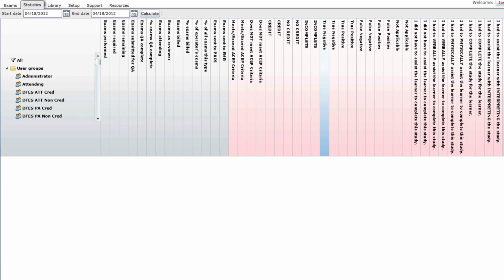If you click on the statistics tab, you can see a report based on ultrasound volume, performance, and credit. You can only see the statistics for yourself. Additional statistics for the group can be run by the core faculty, but in your case, you can only see your own QA sheets and your own statistics to provide privacy. In order to take this data and run a meaningful report, there's an additional video talking about how to take this data and create a report that is more interpretable rather than the baseline display here.